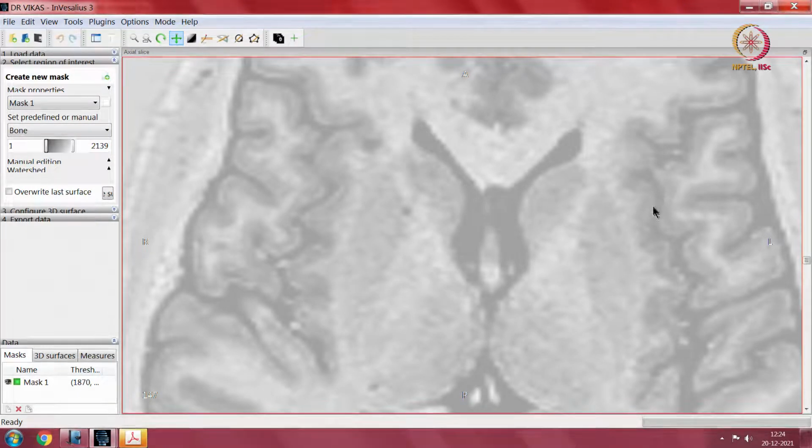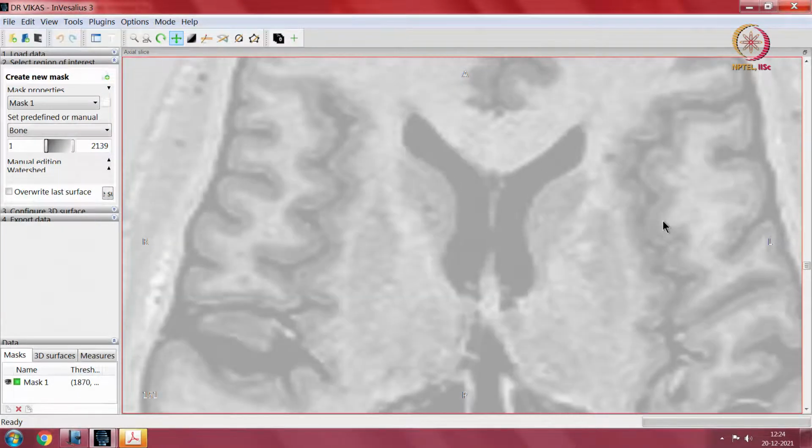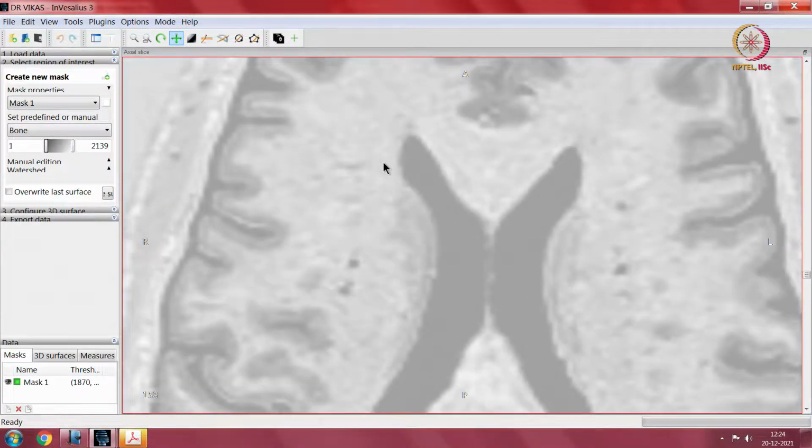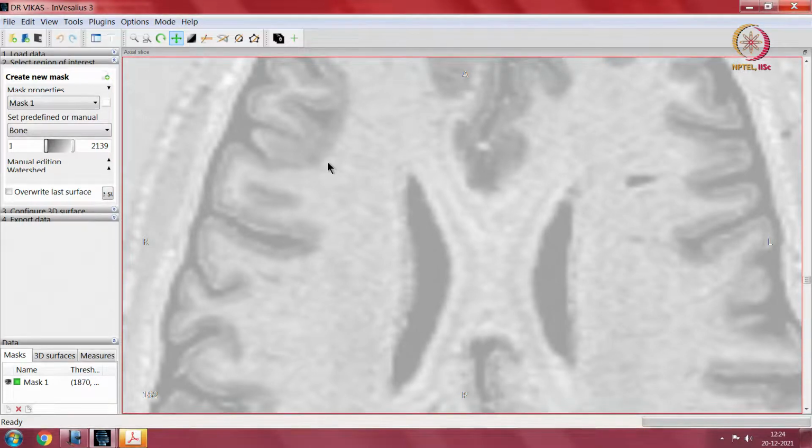Same on the opposite side. So, insula is a surface which is buried under the brain. There is brain tissue here, there is brain tissue here, and in between is this thing called the insula. And so, that's the parts of the cerebrum from the outside.